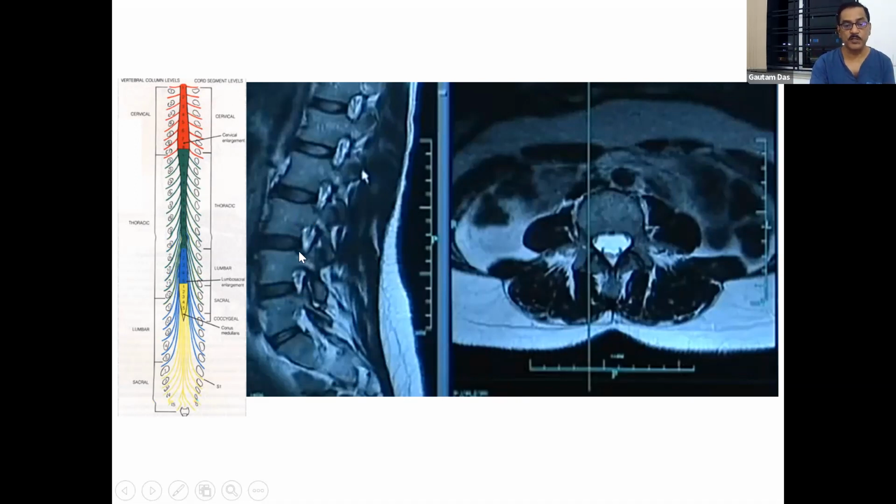The lower part of the foramen is not that wide, and that's why you see the upper part is broad. Why is this white? This is because of the foraminal fat. There are lots of fatty tissues there. Notice this black dot. This black dot is your exiting nerve. So when you come into the foramen, you can see the exiting nerve.